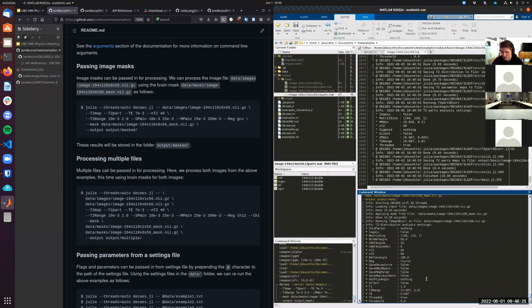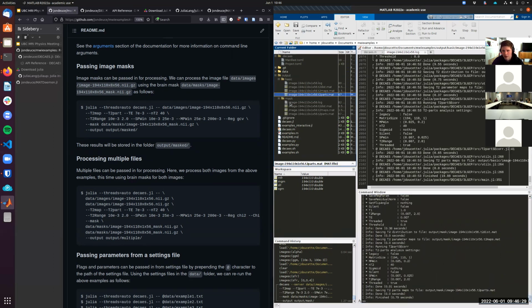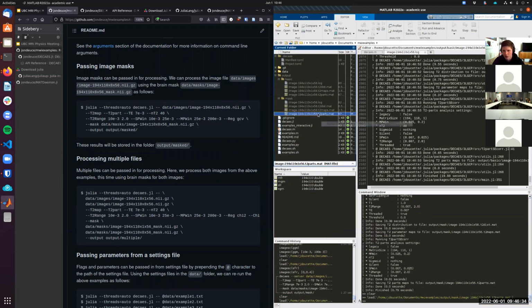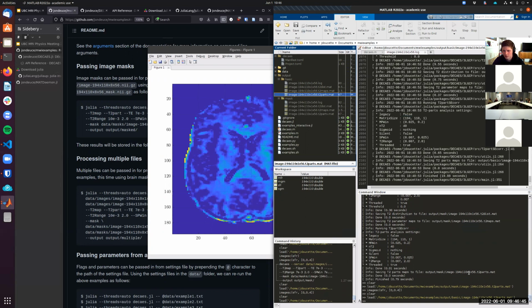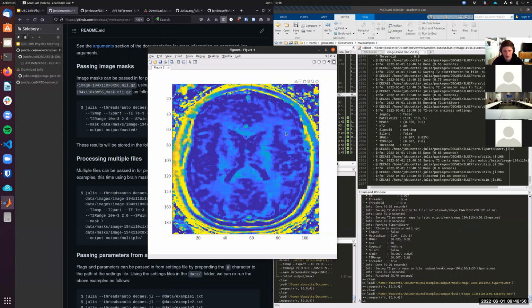And okay, so that ran really fast. So now we have the mask folder. So clear everything. We'll load the T2 parts from there, and we'll plot the myelin water fraction again. And so you can see it's the exact same thing. I'll even compare them quickly. Okay, well, I should have opened a new figure, but I think you get the idea. The other one was the exact same thing, but just with the brain region masked out so that there's none of this stuff from the outside.